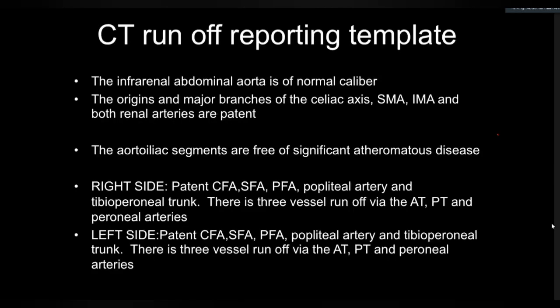This is a template. This is my reporting template for CT runoffs. So this is a normal study. This is almost like a checklist to look at. What is the caliber of the infrarenal abdominal aorta? So is it aneurysmal or not?